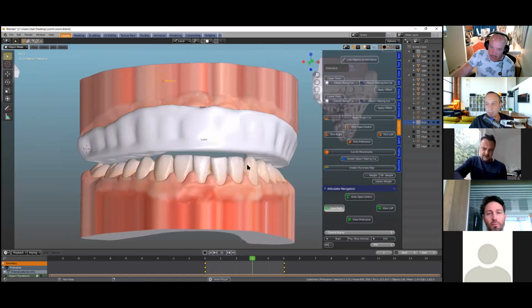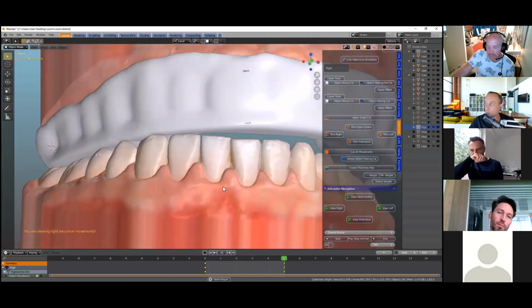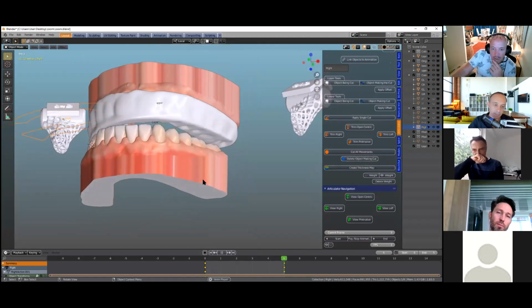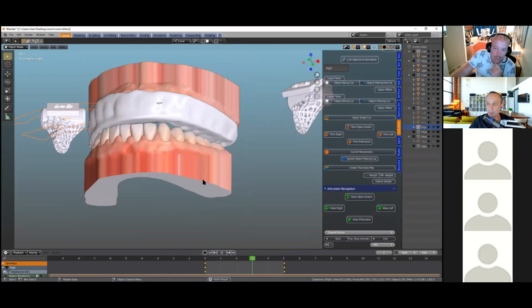If you were to put a patient name on it, when would you do that? At this stage or before you create the inner fitting surface? Well, the fitting surface is always the last, because you don't want to muck around with the mesh.